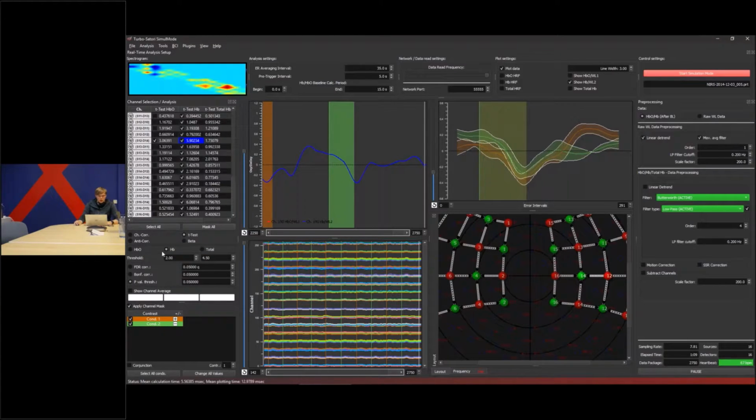So looking at the thresholds here, these basically define the coloring. If I only want to see which channels fulfill our statistical test, I can just scroll down here and see, okay, all the reds, they fulfill our statistics. You can do additional corrections, for example, the false discovery rate correction or Bonferroni correction to check for multiple comparisons.